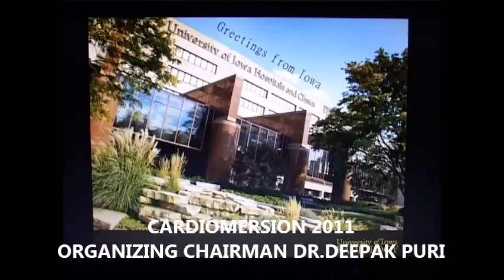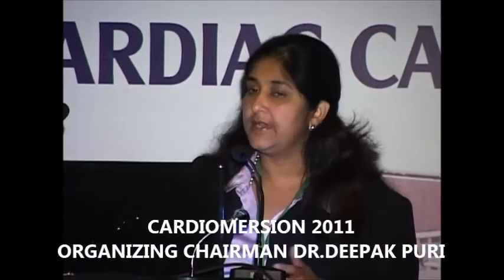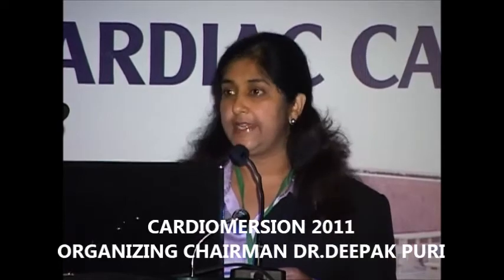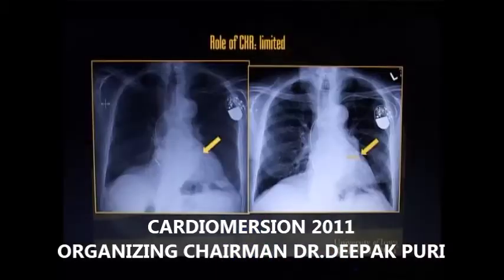This patient was being followed up for pneumonia and basically unrelated issues. We did note that there was a plaque of calcification, and his aorta, for his age, is slightly dilated and tortuous. The subsequent X-ray, which was done as a follow-up of his illness and was not related to the aorta, demonstrated that there is now a bulge in the aorta.